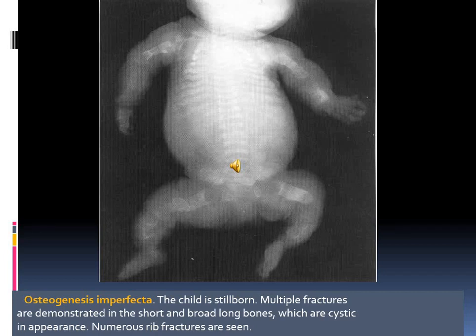This is an important congenital abnormality called Osteogenesis Imperfecta, which is a genetic abnormality that results in the abnormal formation of the skeleton.